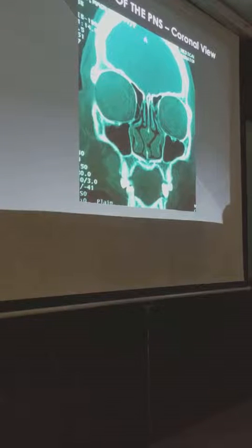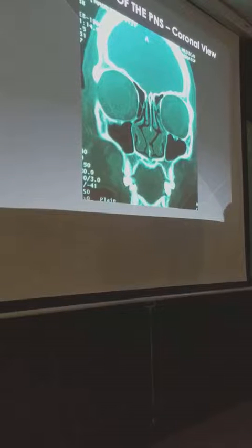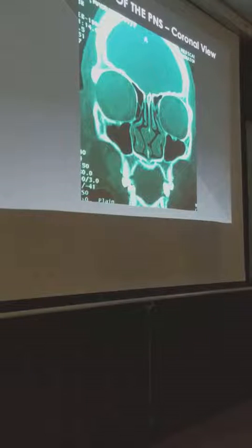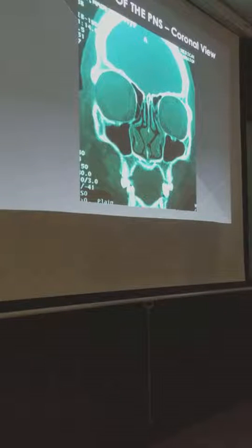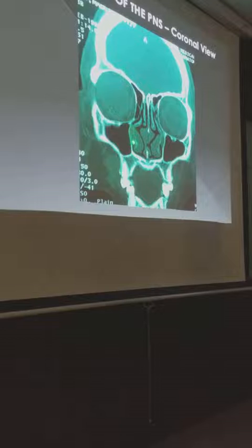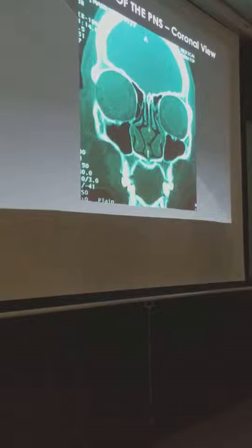So that's very important. But the lower part, kasi remember it's sickle-shaped. So the postero-inferior part, ang attachment niyan is mas predictable, mas consistent. The inferomedial part is usually attached to the ethmoidal process of your inferior turbinate, and then posteriorly to the perpendicular plate of your palatine bone. Kaya yun ang pinakamahirap hiwain, di ba, when you do your uncinectomy. It's at this area where it attaches to the ethmoidal process of the inferior turbinate, and then more posteriorly to the perpendicular plate of the palatine bone. Papakita ko yan mamaya. Next slide.